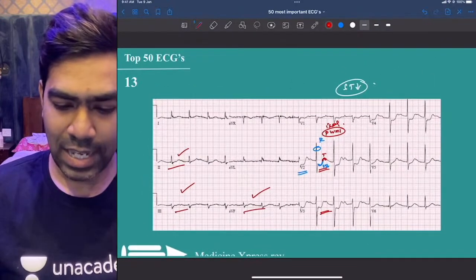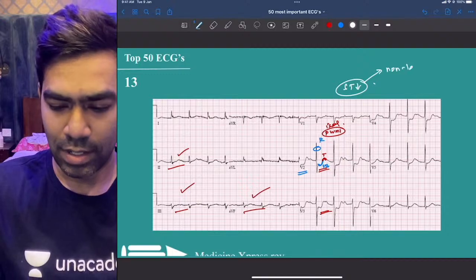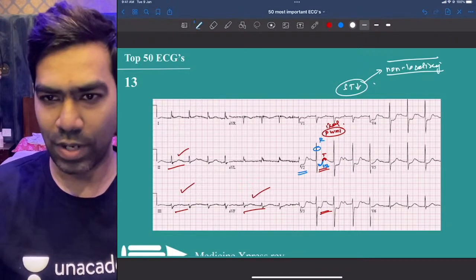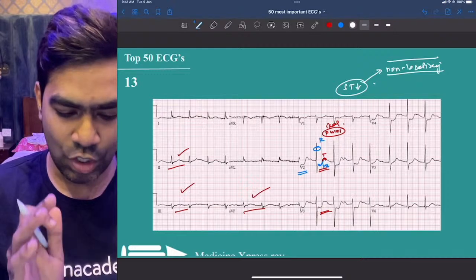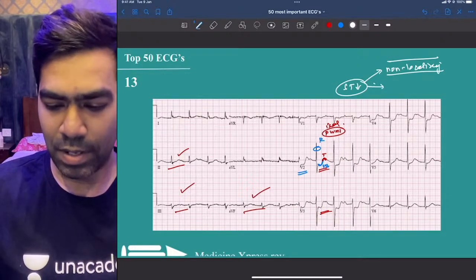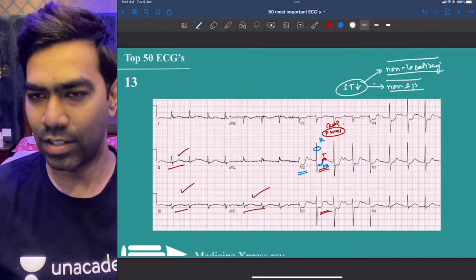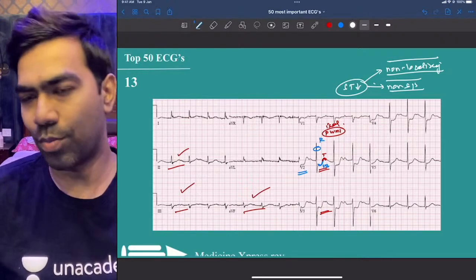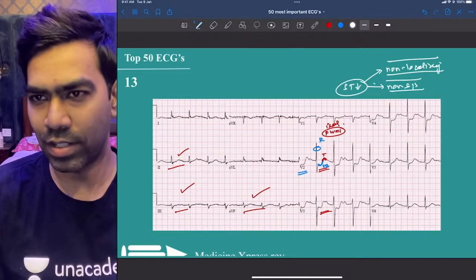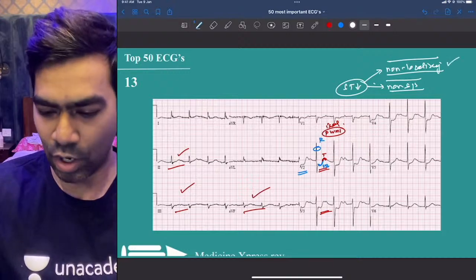Please understand that regarding ST segment depressions, two things are very important. They are non-localizing. Number one, except in few conditions like posterior MI, ST segment depressions are generally non-localizing. Point number one. And ST segment depressions are non-specific findings. You need to always correlate clinically. So what is the patient's symptoms? When you talk about ST depressions, except in situations like posterior MI where it can be localizing to some extent, ST segment depressions in a standard 12 lead EKG are generally non-localizing.